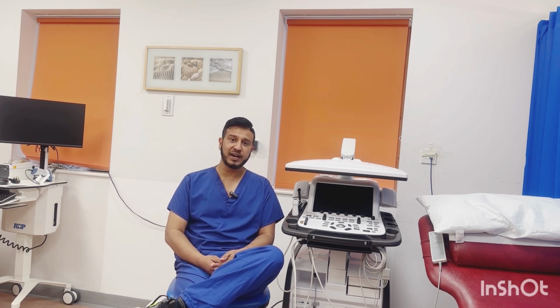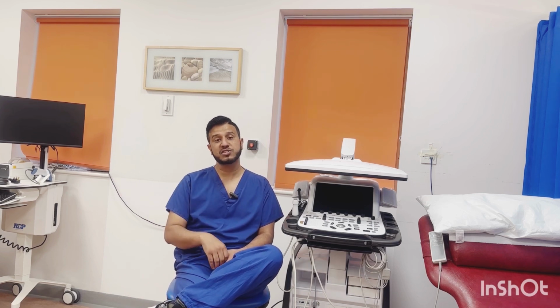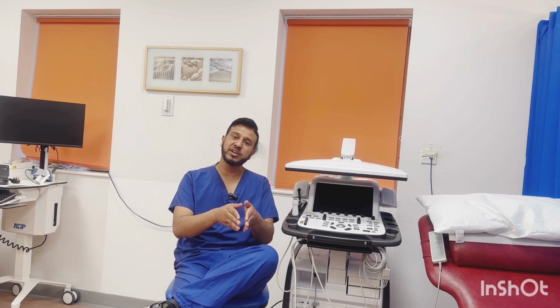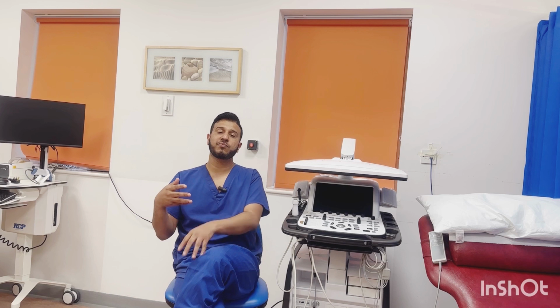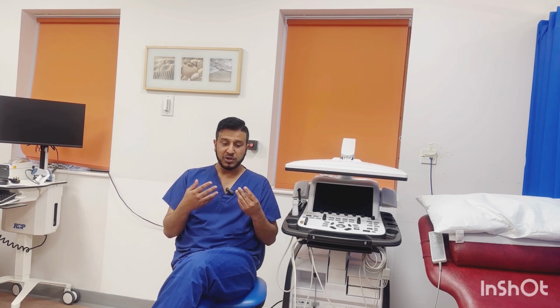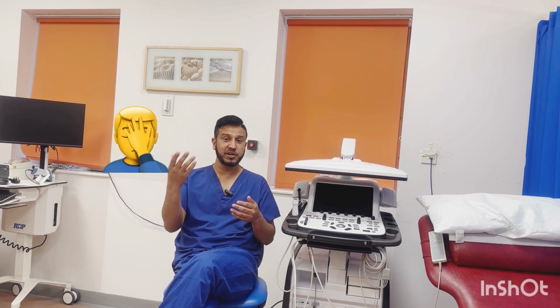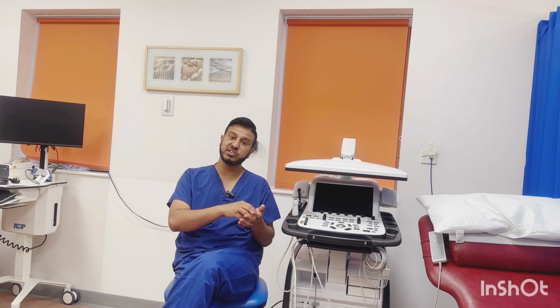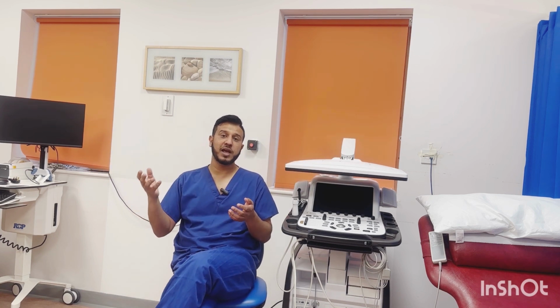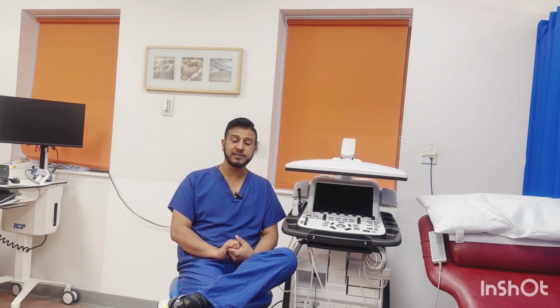If we talk about the guidelines, American and European guidelines are almost the same in this particular situation. British guidelines are slightly different, but if you go into the detail, the concept of all the guidelines is almost the same. I will tell you how you should approach these patients if you are working in an echo lab following the European or American guidelines, and if you are working in a British certified echo lab. First, I will tell you about the European guidelines.